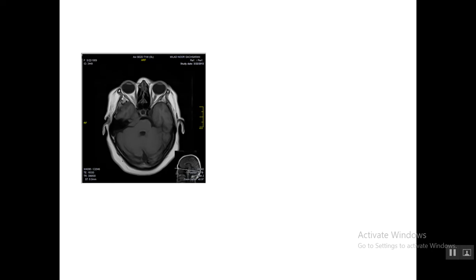The first image, as you know, is a T1 axial brain MR image, and I want you to see the image carefully to find abnormal findings. Maybe normal or maybe abnormal in these structures, but I don't show you the abnormal finding in this picture, and take a guess please before we continue to show the other slide.